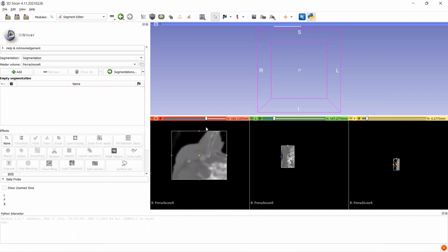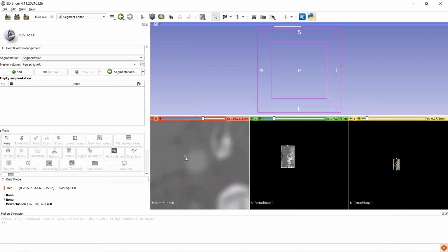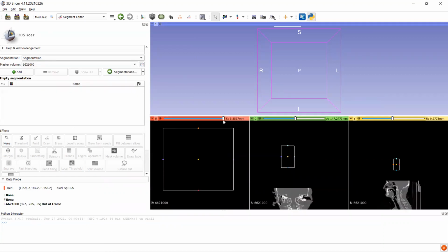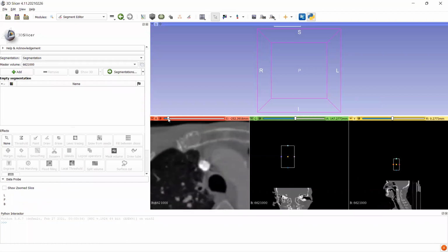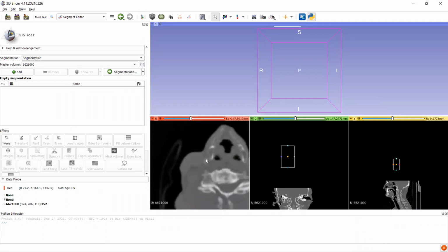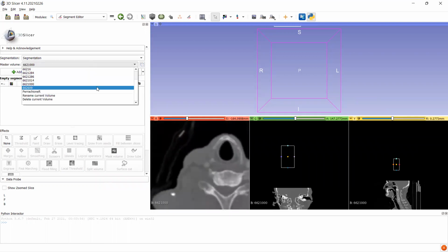So if you're having trouble finding the region of interest, look for this pattern. Look for the common carotid artery, and you're going to look for it just coming up from the lungs. You can see it starts right here. You can see it's on the left here, on the right here, and you can just follow it up. See, it's right here. So you really start from the top of the lungs, find the slightly lighter spot, and then you can follow it all the way up. That should be pretty easy.